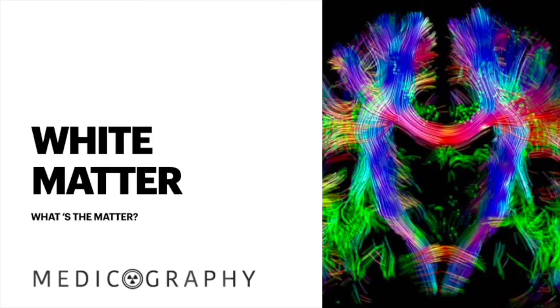And in this video, I'm going to talk about white matter. What's the matter? And the matter that I'm going to talk about is the myelination on white matter, how it appears on MR, and also focusing on DTI, the diffusion tensor imaging on brain MR. So let's jump in. I hope you enjoy.